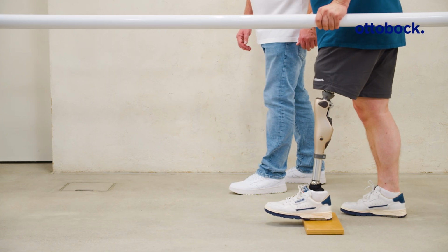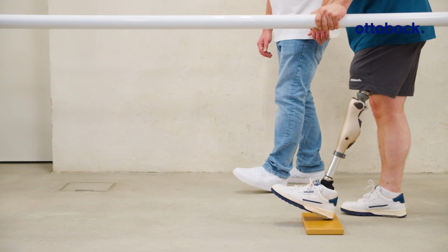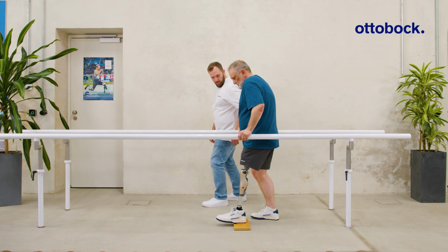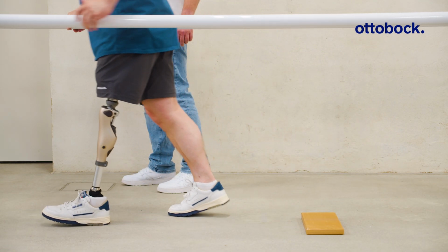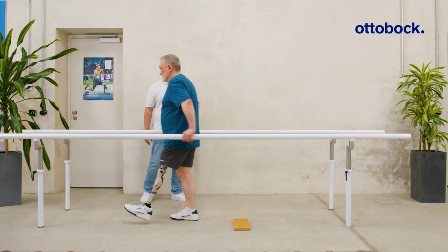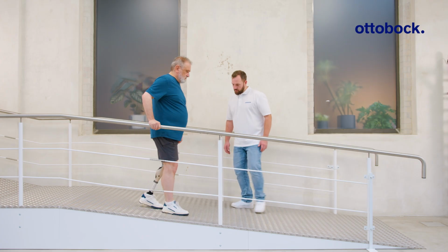In this activity mode, the knee joint provides controlled stance phase flexion of up to 10 degrees. As in Activity Mode B, stance release occurs late in the stance phase. As a result of the stance phase flexion, users can also descend shallow ramps step over step.